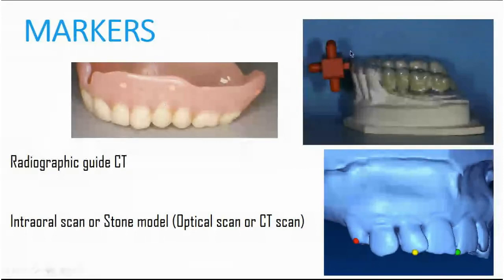This kind of the markers, where we have strictly predefined the shape and the size of the marker, we use in situations where we have available teeth, but with some problems which will make it difficult for us to match data.